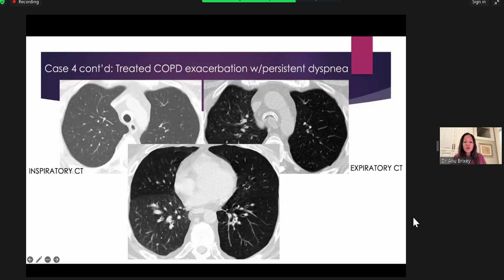So in an expiratory CT, the patient breathes all the way out. So everything should turn whiter, right? Everything should look like this. But that didn't happen for this patient. And so what that indicates is that this patient is having severe air trapping, which can cause that feeling of shortness of breath. And so now when we look higher up in the lungs, look at the trachea.